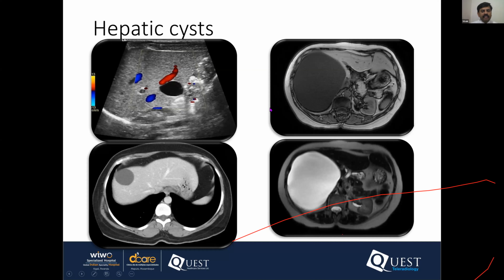This is again clarified and confirmed on MRI scan, where we see a complete hypointense water signal intensity on T1, and the exactly opposite, very much hyperintense, well circumscribed lesion on T2. And as you can see from both the series of images, the cyst size may differ, whereas this is a small to medium cyst, this is a giant cyst.